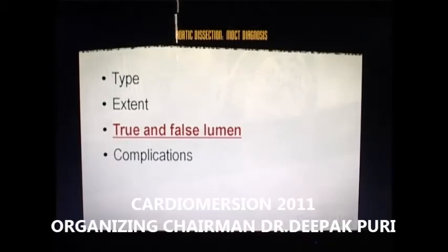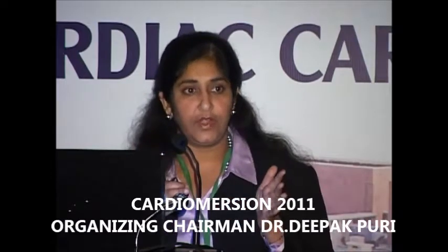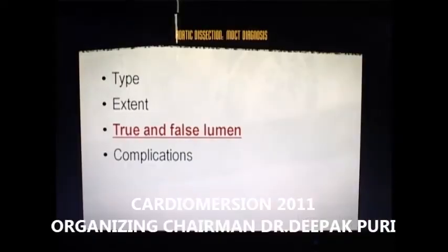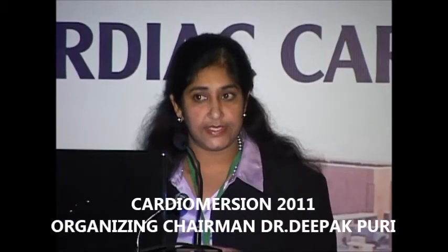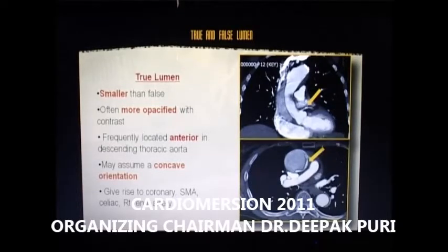True and false lumen. Now, this is an important part of the evaluation to be able to determine. So usually, what I find most reliable is that I follow the left ventricular outflow tract on my axial images, and whatever lumen continues is the true lumen. However, there are other ancillary things that you can look for. The smaller lumen is the true lumen usually.